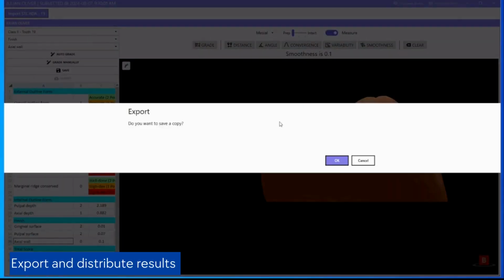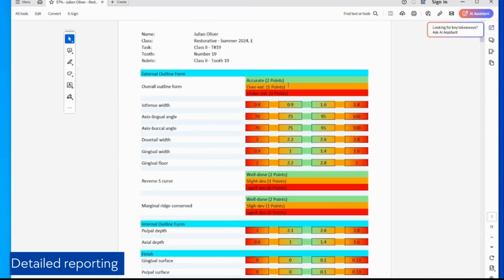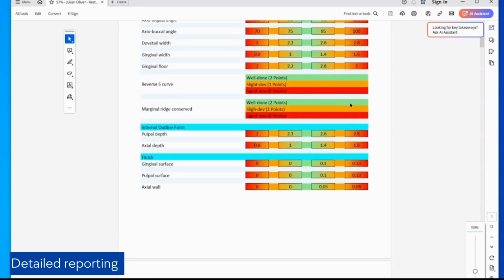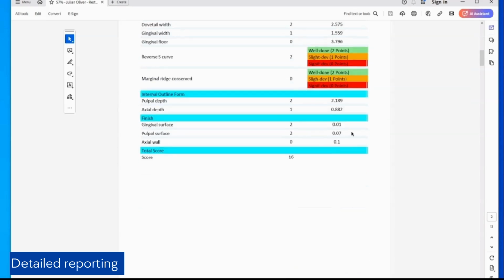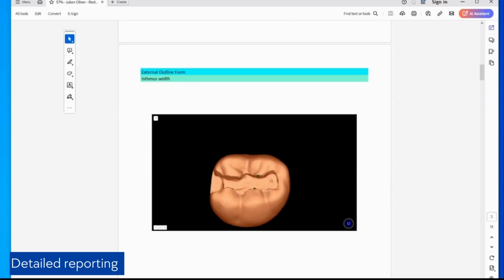Once grading is complete, results are compiled swiftly, ensuring efficiency. The results are saved for future reference, facilitating consistency in grading across multiple instructors. Upon final submission, a detailed report is generated for the student, providing comprehensive feedback on their performance. In case the grading is assigned to multiple instructors, they can work collaboratively. Once the grading results are analyzed, saved, and uploaded, they can be scheduled for distribution.